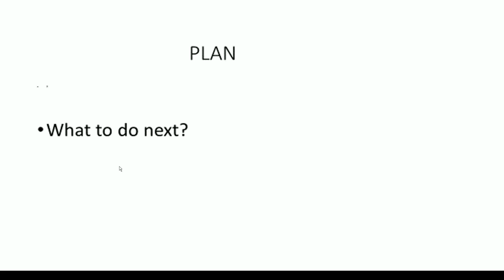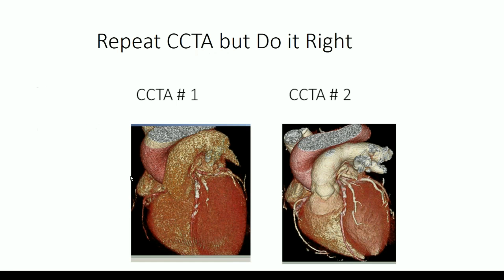It's kind of a waste of radiation. He had a full dose of radiation. They did the ejection fraction as well. So we decided to do a low dose radiation picture to see what his images look like. This is the CT he had at Largo Medical Center for $250. Here's the CT he had for $199.